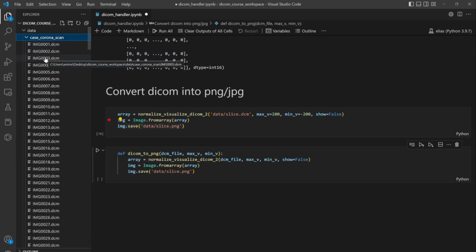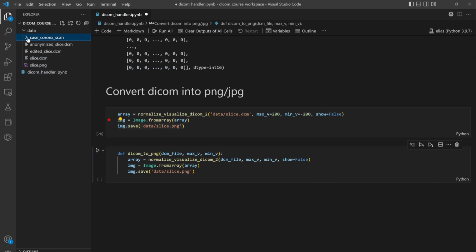I know that this is basic, but I just want to say it. You need to give different paths or different names of the files if they are at the same path when you save them. So we need something else here, which is more important than this, which is the PNG files, or PNG path. Because you will need the path where you want to save the images plus the name. The name we will extract directly from the slice, but the path we need to give in the parameters. So let's do that.